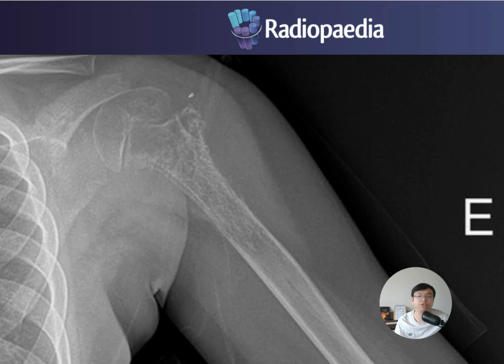So what else do we need to do? We need to try our best. I know that radiography may not be a very suitable modality to fully assess for other related lesions, especially those skip lesions. Better use MRI. However, we need to try our best. Okay, for example, is there any erosion to the physis? Usually, there is a well-demarcated cortical line, okay, outlining the physis.